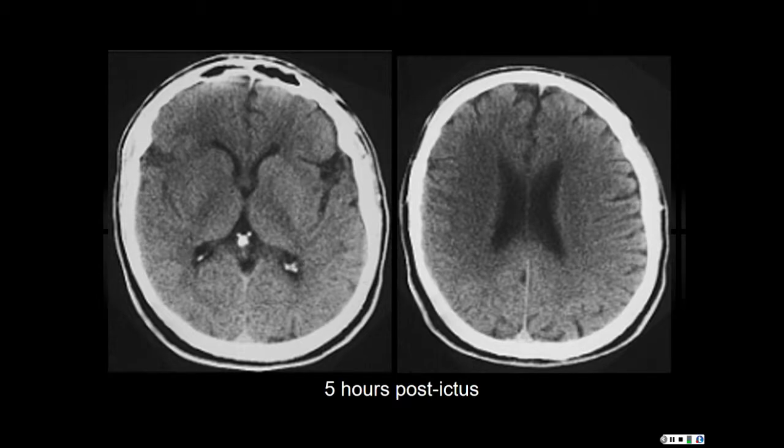Basal ganglia. Let's take a look at the basal ganglia. I really need you guys to be very, very careful and deliberate now when you're looking at the basal ganglia, because this was a stroke that was picked up within 6 hours looking at these signs that I'm sharing with you.